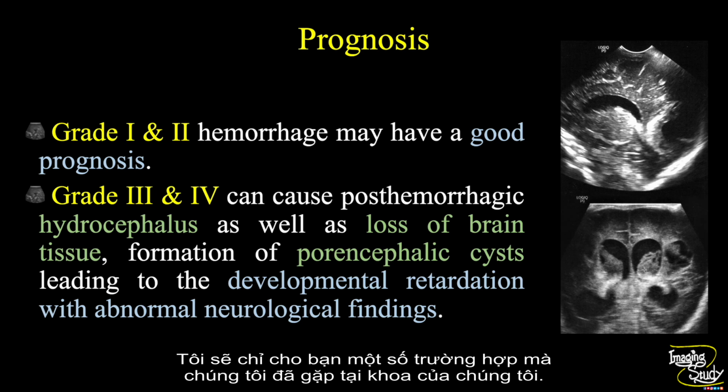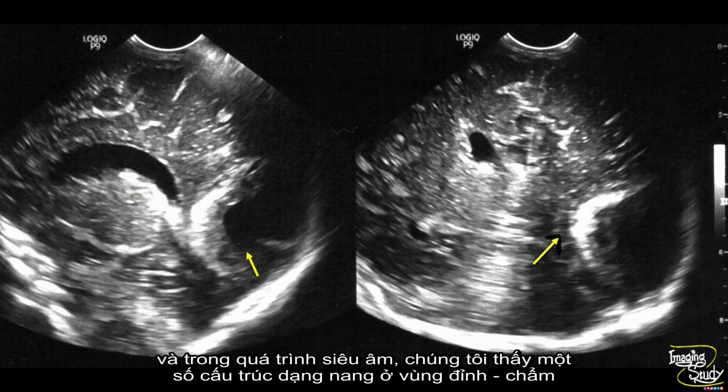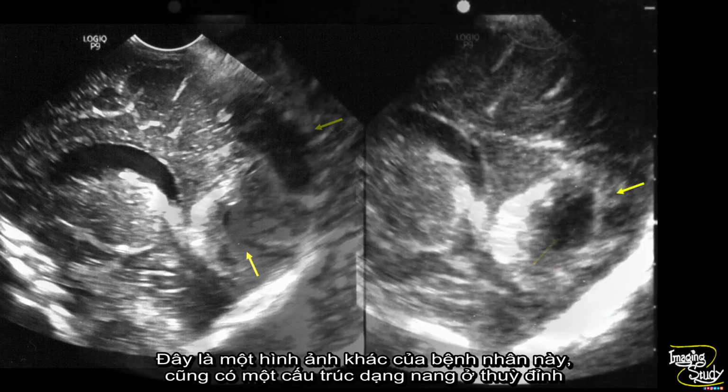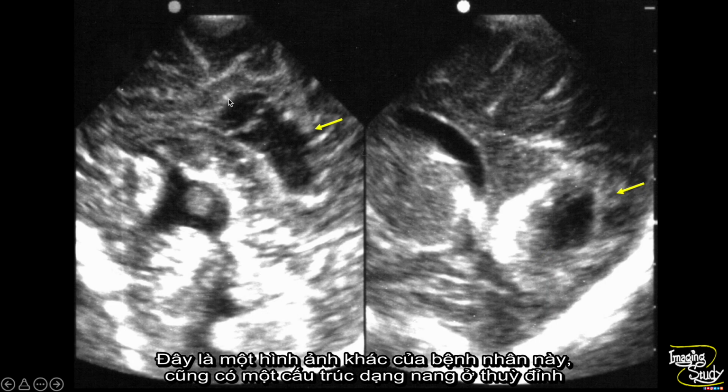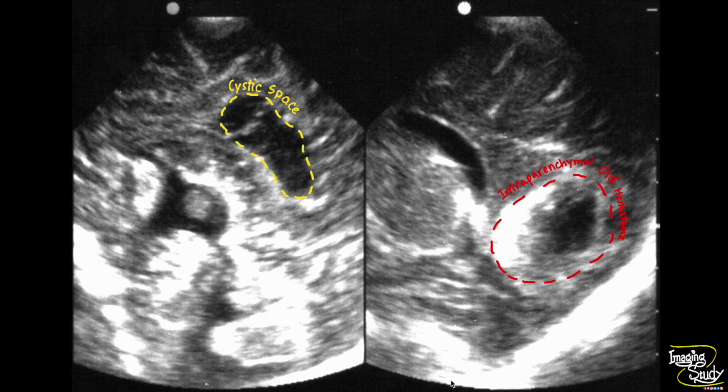Let me show you some cases that we have got in our department. This is a patient with a history of grade 4 intracranial hemorrhage, and during our scan we have seen some cystic space at the parieto-occipital region indicating porencephalic cyst formation. Here's another picture of this patient. There is also cystic space in the parietal lobe, which is nothing but a type 3 periventricular leukomalacia.